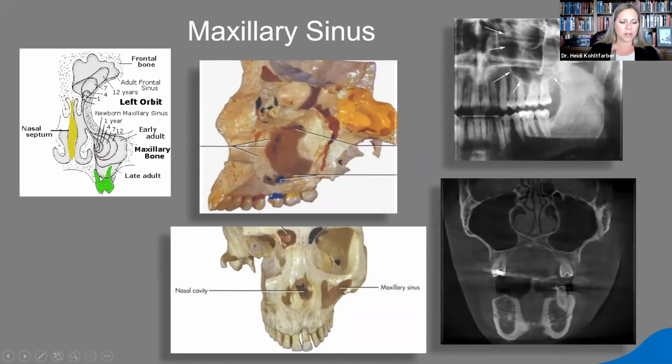But it's very important to realize that sometimes sinuses are not symmetrical. In fact, when we like to sit and talk about symmetry, and we talked about there's certain anatomy that is not symmetrical, our sinuses are not usually symmetrical. So it is possible to have a very, very small little sinus known as a hypoplastic sinus, and that is considered to be completely normal or variation of normal. Many times we'll see there's a mucosal thickening in it, though, because the sinus drainage pathway has not developed properly.